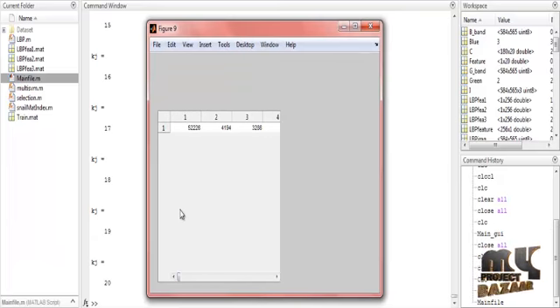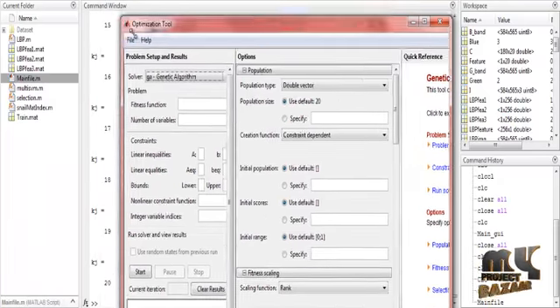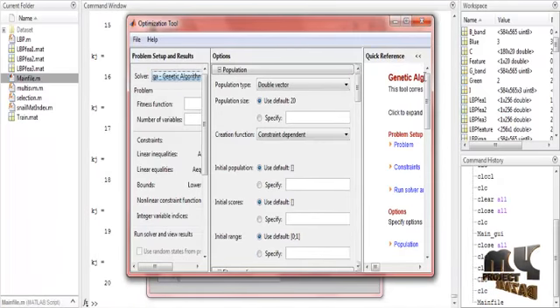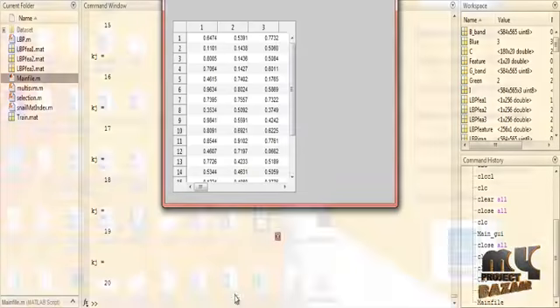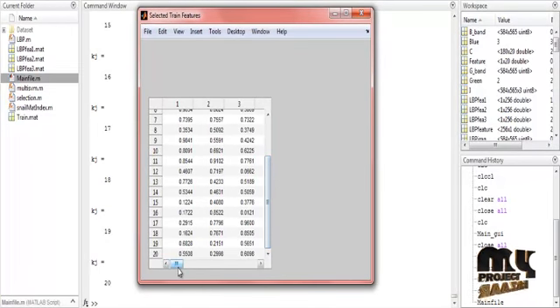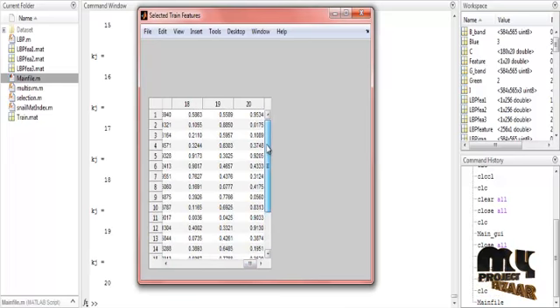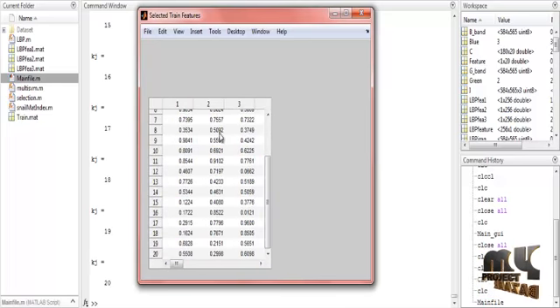In the feature selection process, the 256 resized features are selected using the genetic algorithm. This is the optimization toolbox of MATLAB, the genetic optimization toolbox. This is also an input function of the process, used for feature selection. Then the training features: I have 20 images in the dataset, so I extract the features for all 20, and that is displayed as 20 cross 20. I will select it. These are all the images for the process.